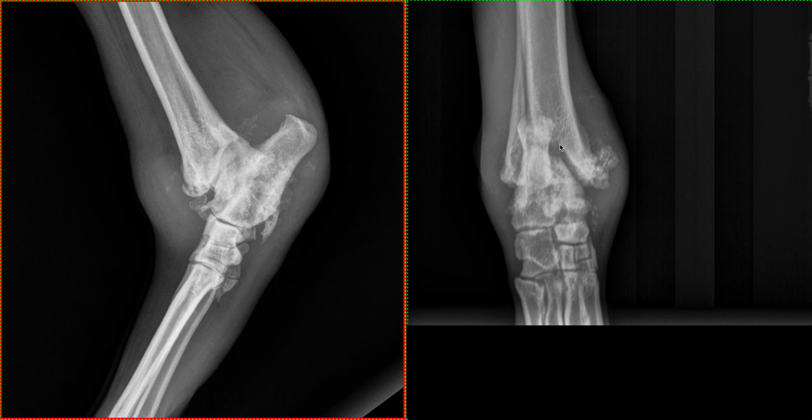If we look closer at the subchondral bone margin of the distal tibia, we do have a bit of loss of the cortical bone, and this can be associated with previous scoping, or this can represent current lysis associated with this active inflammatory process that is currently ongoing in this joint space.